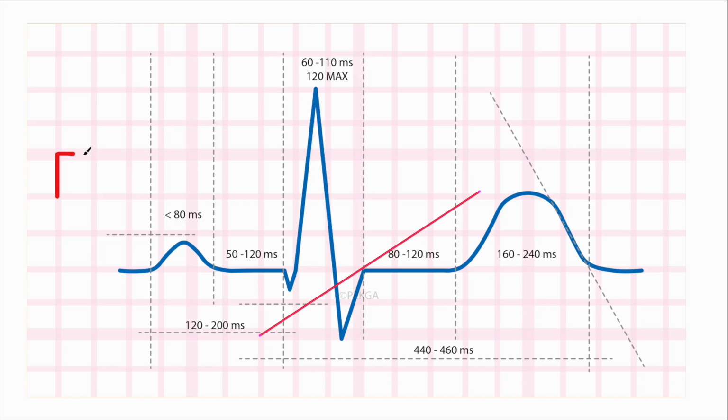If you were to draw a line from this point to this point, you will have a slope. Now, a sharp slope is a slope that has a far greater rise over run. So it moved up 2 and over 1. So this is a very sharp slope, a sharp angle.